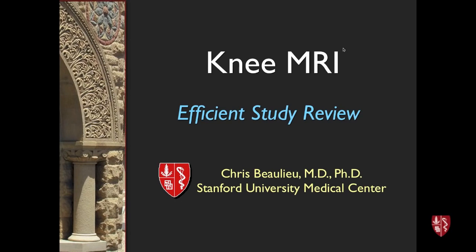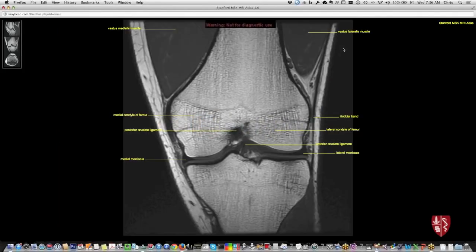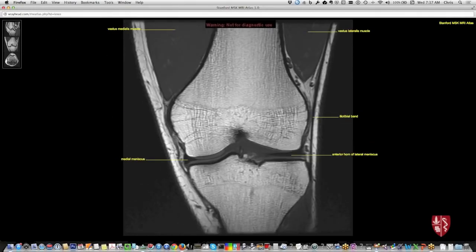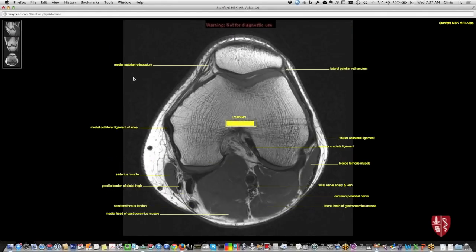So I have a number of cases teed up in Osirix to review directly in a PACS environment, and just a few slides. One thing I wanted to point out in the beginning is that Baudot and helpers have a really nice atlas of MSK anatomy on xrayhead.com. On that, you can scroll interactively through these sequences. You have coronal, sagittal, and axial, and they're nicely and accurately labeled.